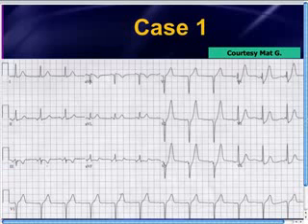I don't have the age and the patient presentation, but let's just pretend that this is a person coming in with chest pain. And I'm pretty sure it was chest pain. And here's the 12-lead EKG that Matt had sent to share with us. And there's a handful of abnormalities here. There's no surprise, first of all, there's ST segment depression in a bunch of leads.